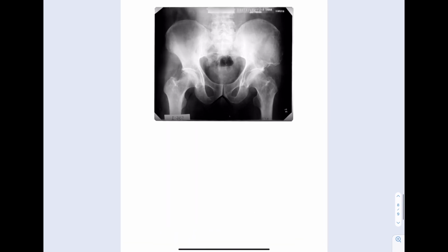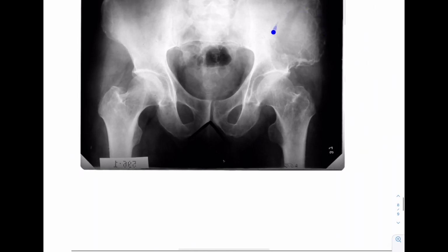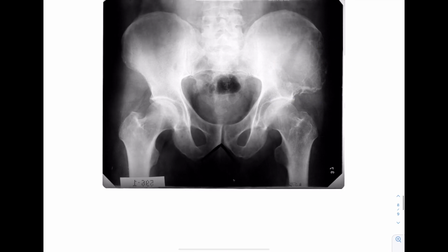Okay, right here, this is definitely an older individual. Just based on looking at it, we see degeneration, which you're going to learn more about, but I do see degeneration happening. But I know this is an older individual. So older individual, geographic lytic lesion. It's right here. Older geographic lytic. Well, I already know. Older geographic, we have fibrous dysplasia always, plasmacytoma, and blowout mets.